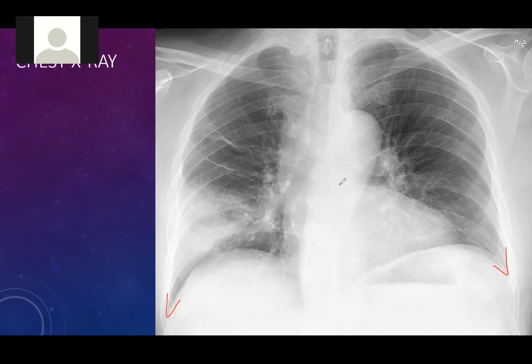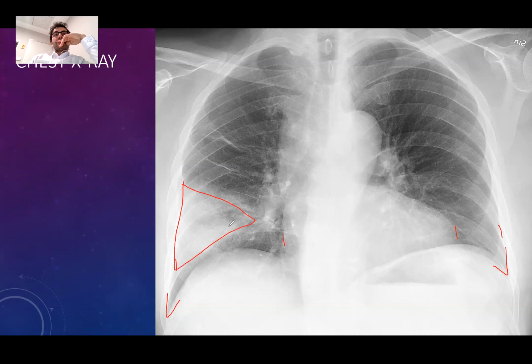Now the heart, I think it's enlarged. I agree. It is enlarged, right? All right. The aorta is kind of enlarged. Yeah, the aorta is enlarged, right? Now I'll go to the lungs, and I see this on the right middle lobe. I think there's. Yeah. Good guess. I agree. Probably. Okay.